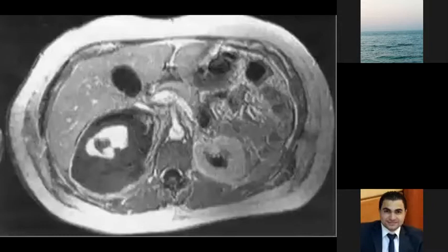Okay. And this patient, for one reason I don't know, had an MRI, and you can see what is going on in the T1 of the MRI. In this lesion, which is the retroperitoneal lesion, there is an area inside this lesion with signal abnormality. What do you suggest is this high signal in T1? What could it be?